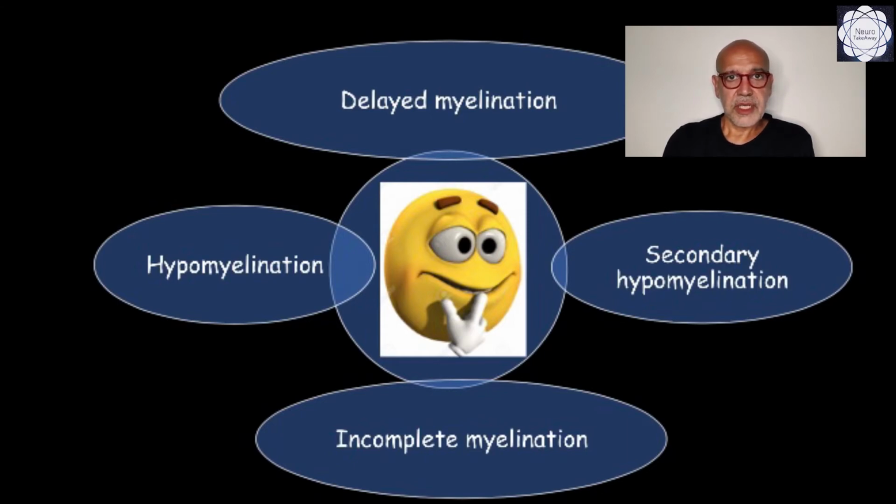The fourth concept is the concept of incomplete myelination. As you know, there are some regions, for example, the peritrigonal white matter or the juxtacortical frontotemporal white matter, that last longer in developing, leaving their myelination process incomplete. So these areas can't be taken as hypomyelination because they are expectable to a certain degree up to the second decade of life, and they are located in very specific areas.